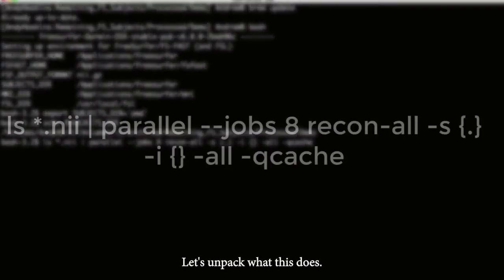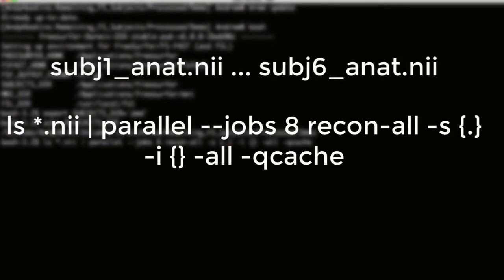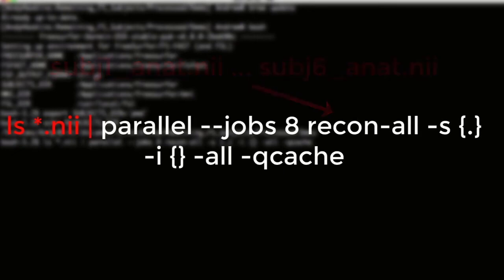Let's unpack what this does. Assume that we have 6 anatomical images in our directory: subject 1 anat.nii up through subject 6 anat.nii. The expression ls *.nii will grab every file ending with .nii. The vertical bar, or pipe, means to feed those file names into the following command.